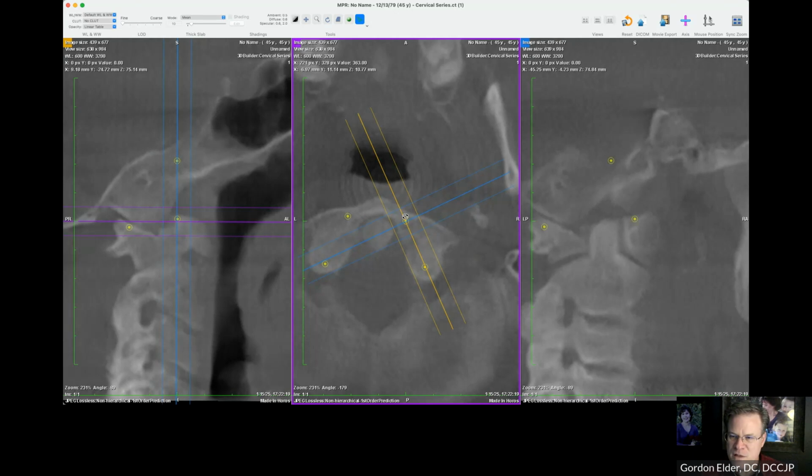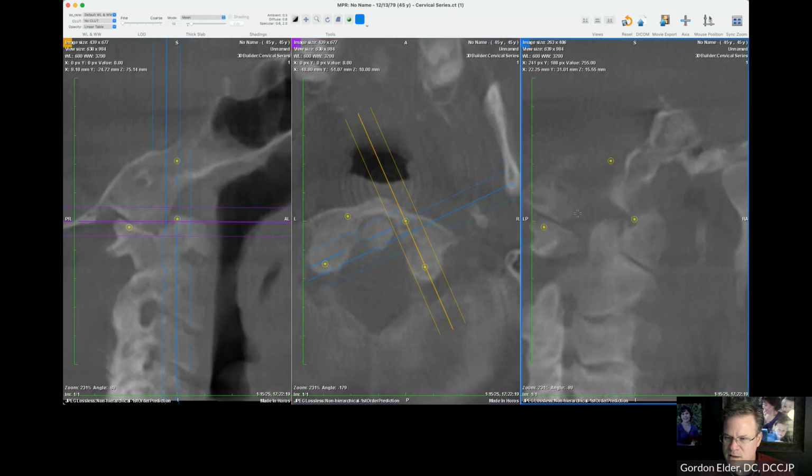If you rotate only one thing, then the measurements would be off on that one. Obviously, I wouldn't want to measure the convergence angle when I've rotated this, because then I would say, oh, the convergence angle is 0. That's not my reference point in this plane, but it didn't mess up these two other planes over here.